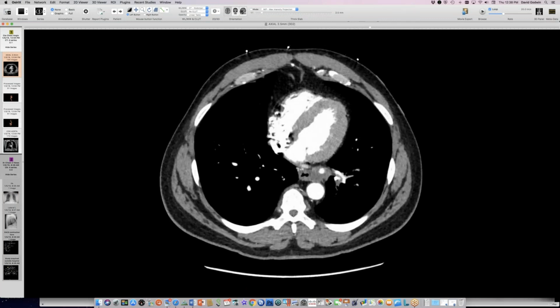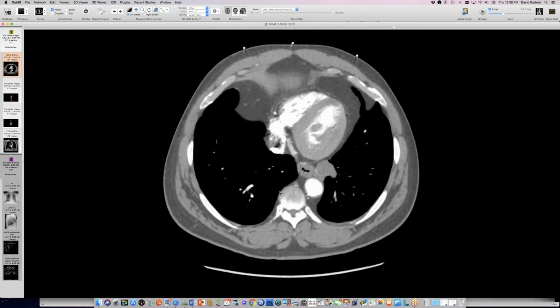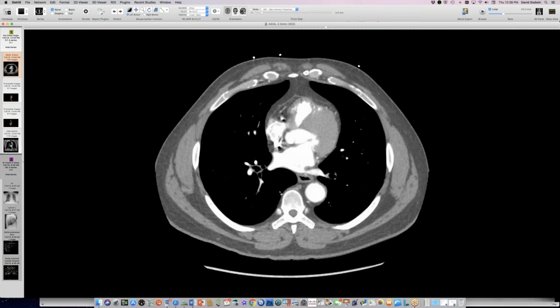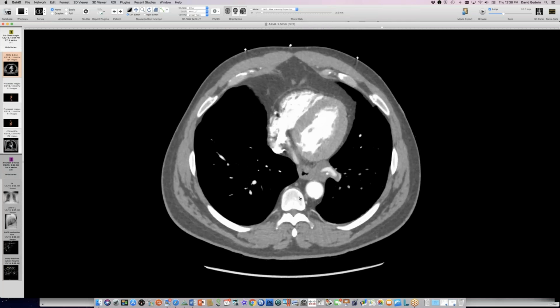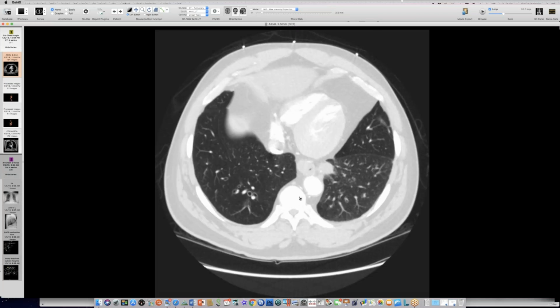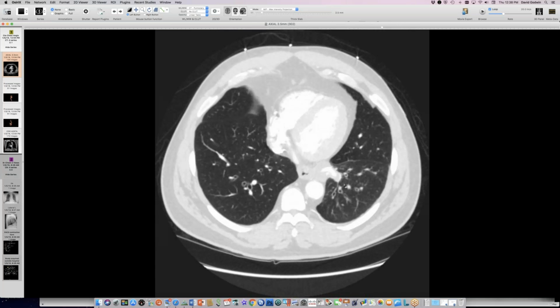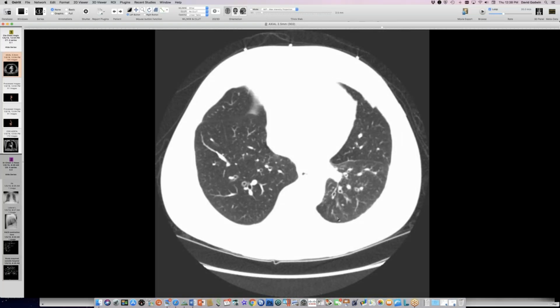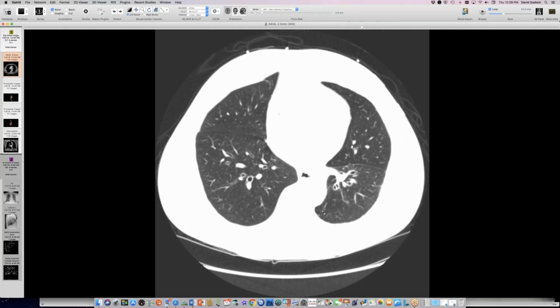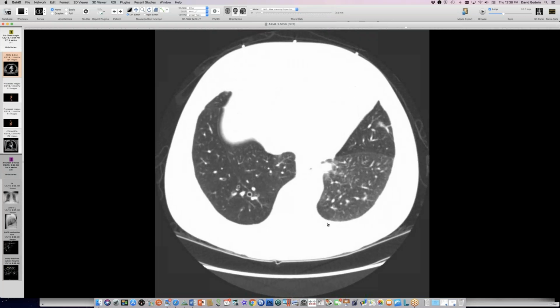And the blob contains a very large vessel coming off the aorta and heading into the lung alongside the inferior pulmonary vein. So we have this systemic artery going into the medial left lung, and the lung parenchyma around this blob is pretty normal. There's a little bronchial wall thickening down there, but there's no emphysematous component. There's no cystic component. I don't know. Maybe on an activist day, I'd say maybe there's a little emphysematous component back here. Maybe, yeah. So let's include that.